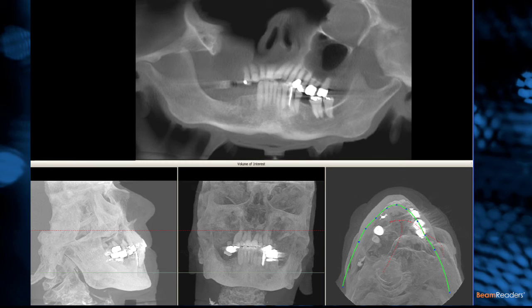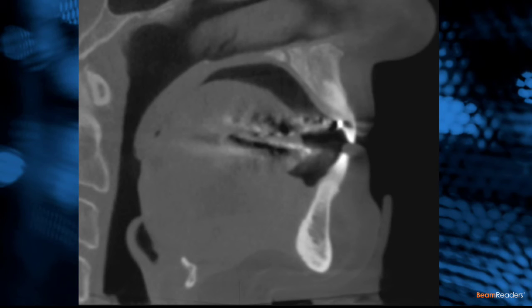This is obviously not how you want to position your patient. This is just a raw scan right here with the chin way up and the head is twisted. And if you take a look at the inferior aspect on the patient's left, you can actually see a carotid atheroma in there.